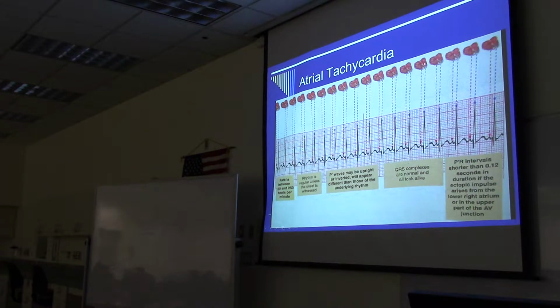All right, this is showing P waves. So it's a fast rhythm between 150 and 250, but this one maybe is showing P waves.